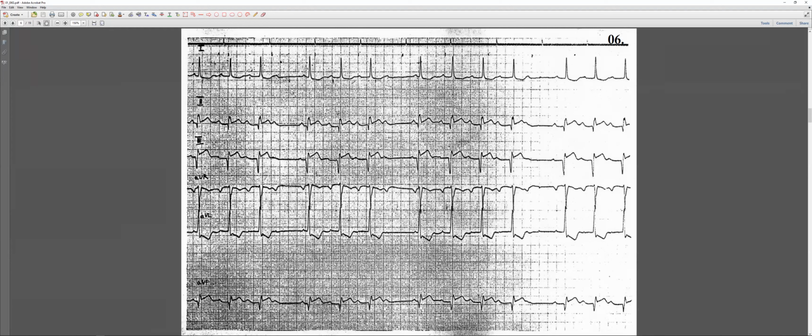after that, we see if a P wave is present. I think the P wave is present, but the PR interval seems to be irregular from point to point. From here we can assume that since the last PR interval is longer than the first one, this is a second-degree AV block, Mobitz type 1.